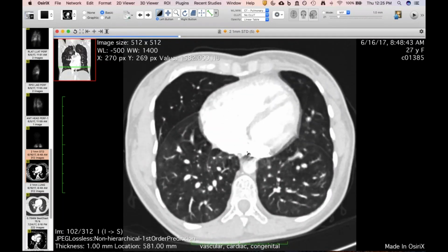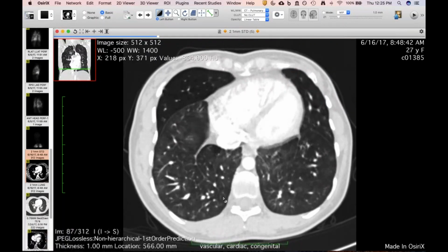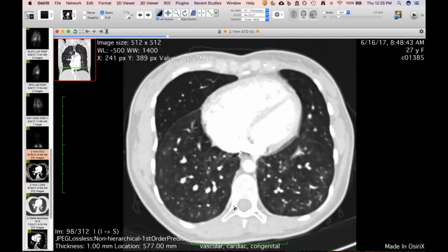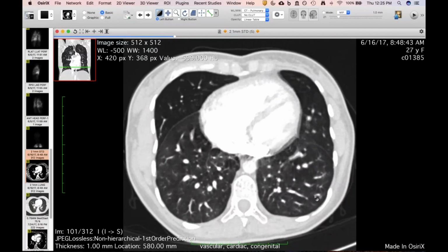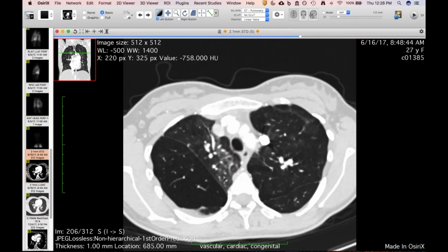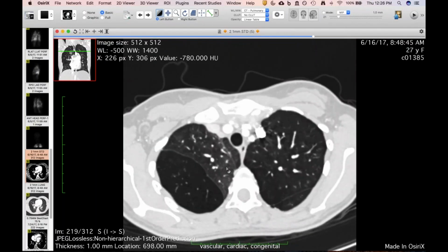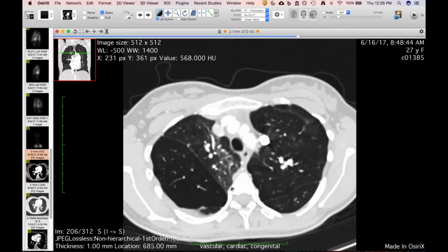I don't think she has Eisenmenger yet, but you can see she's got typical findings of pulmonary arterial hypertension as well, with some of these little smudgy centrilobular ground glass opacities and the corkscrew vessels that we often see in these patients. So, wow, just another pretty dramatic case. And she's got some volume loss in the right upper lobe, so I don't know if she had prior TB or something with scar in her right upper lobe.